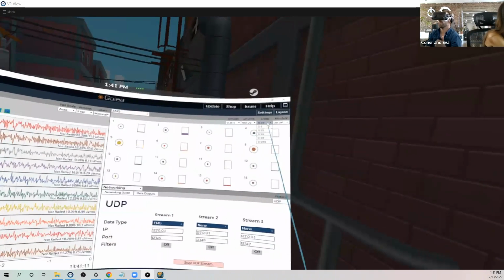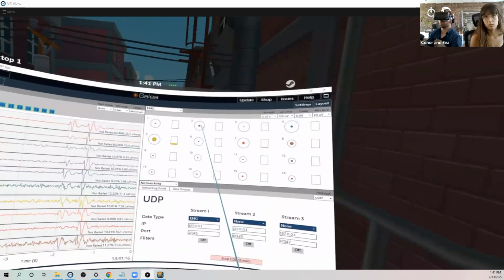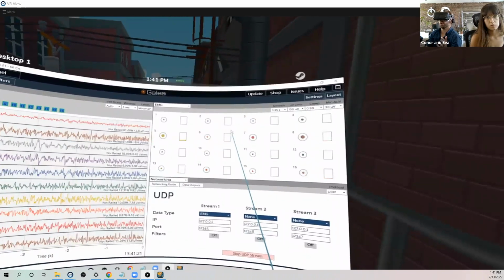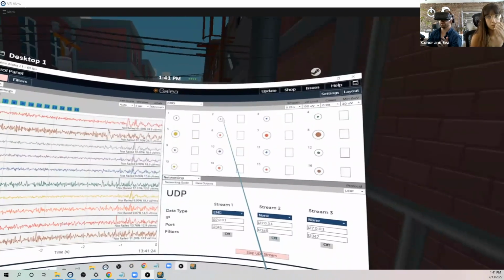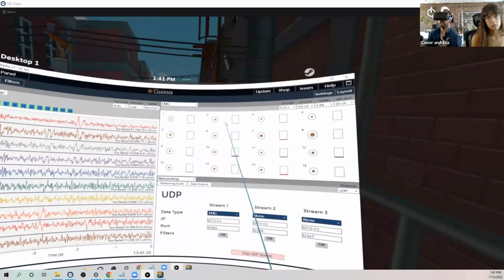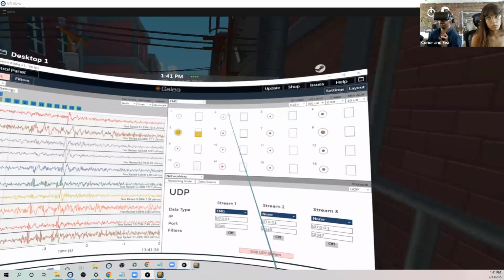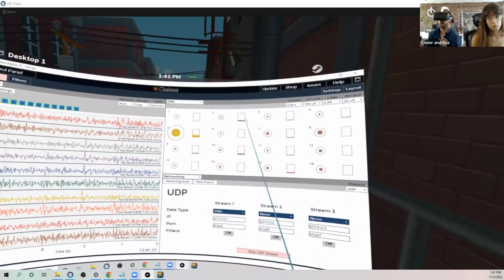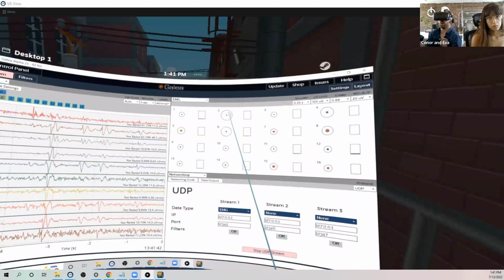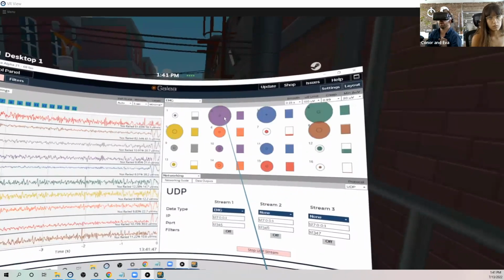The creep is a little trickier. The way this system works is you can see that there's an inner circle and an outer circle, which are defined as the upper and lower limit of your EMG range. And then there's the actual colored circle that sits between those two limits. What we're doing is normalizing the current colored value between the lower limit and the upper limit, and that's what gets represented in this bar graph. So the purple value in here is this purple circle and where it sits between the lower threshold and the upper threshold that we're calculating.